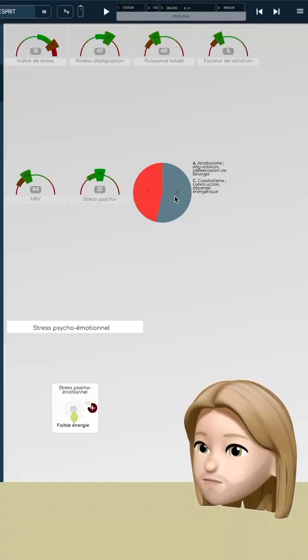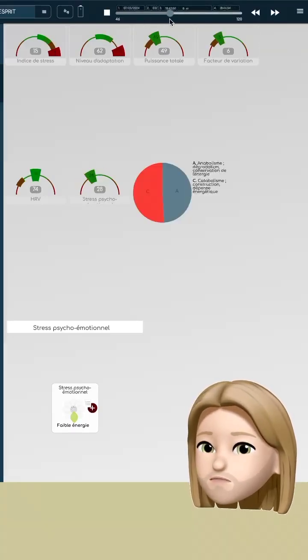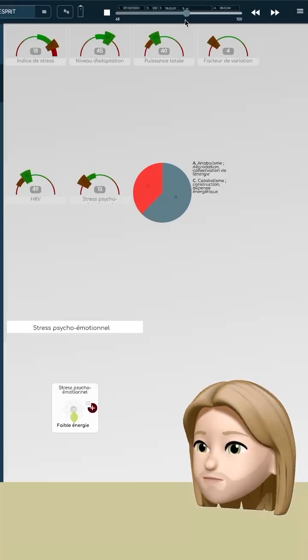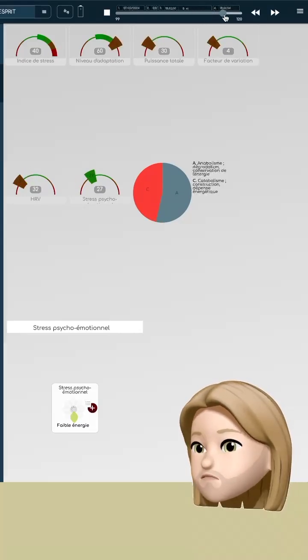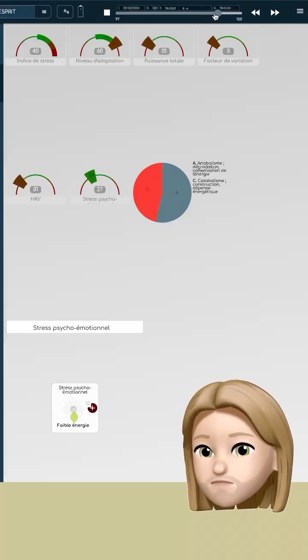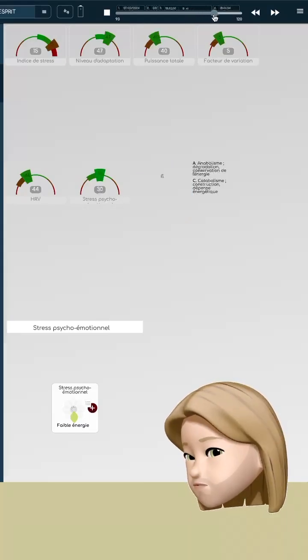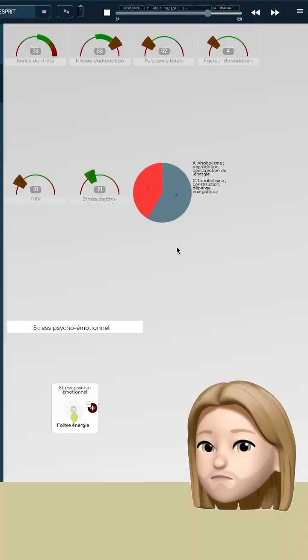This is a fairly dynamic marker. When you start walking around in there, you can see that it's moving quite a bit. So this is when it moves. As you record, you can see that all the cursors move because everything in our system is dynamic.